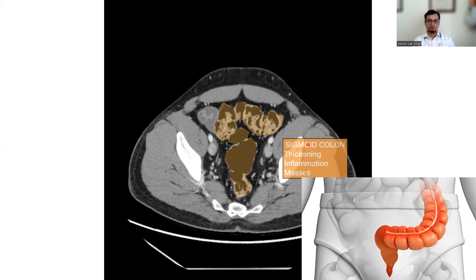Okay, so this is your pelvic brim. So at this level, it starts and it is a continuation of the descending colon and becomes the rectum, okay, at the level of S3 or third sacral vertebra. And there are many different conditions that can cause problems with the sigmoid colon, which include colon polyps and inflammatory bowel disease like ulcerative colitis or Crohn's disease. And also sometimes you might see cancerous growths, fistula, and diverticular disease.